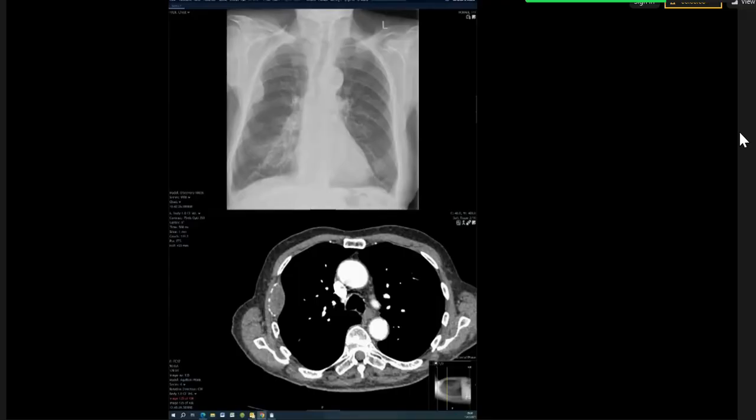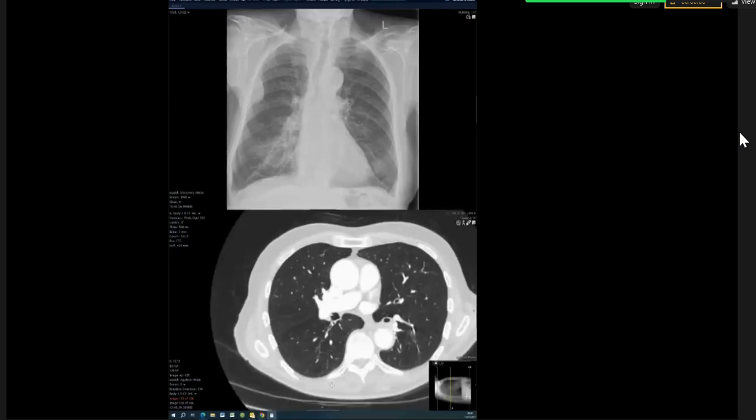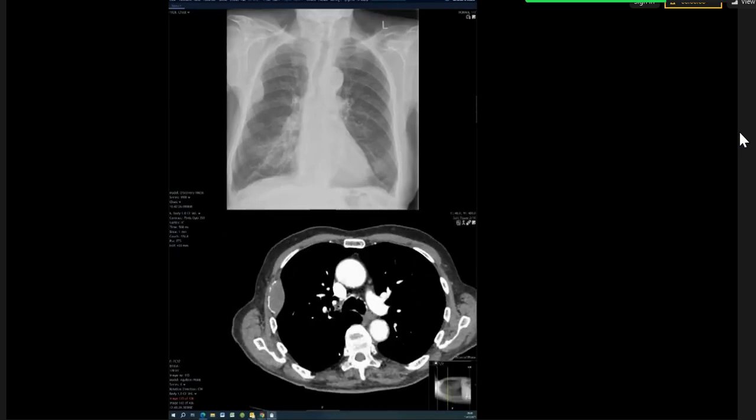There's nothing else wrong with the patient. It's only this isolated abnormality. So in this instance, I would look at the lung windows. I would interrogate the hilum and look for a primary in my immediate imaging. And then I would do a CT abdomen and pelvis with contrast. Then if everything has been excluded and there's no other primary found, I would think about a primary bone tumor.